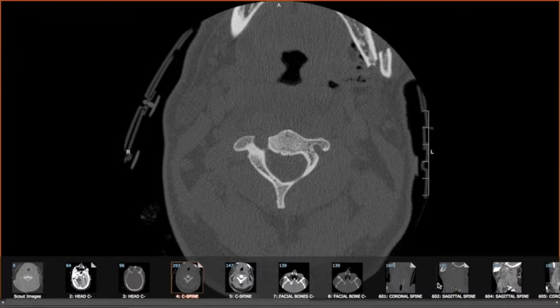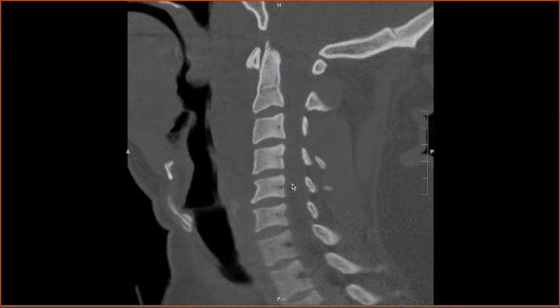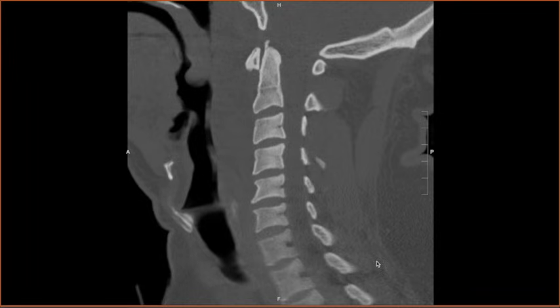Okay, so after we've evaluated the craniocervical junction adequately, we move on to looking at the alignment, and then for subaxial spine fractures, then we look at the soft tissues, etc., etc. You can go back and look at the full approach again earlier in the video, but I'll save us some time here. The rest of this case was normal. So this was a case of more subtle craniocervical dissociation. It really stresses going through your full approach and looking at the craniocervical junction in detail to see more subtle, severe injuries.